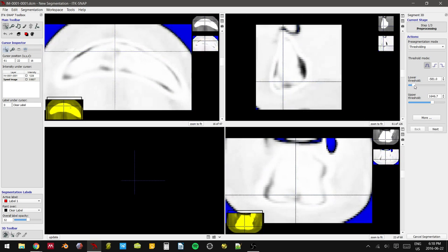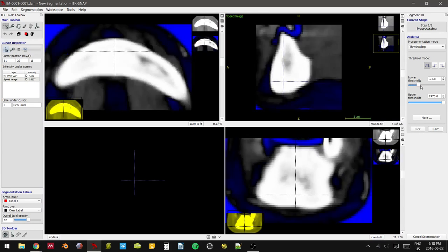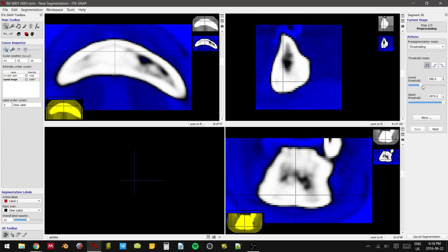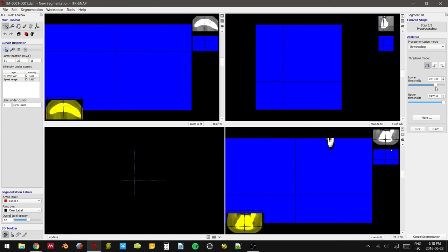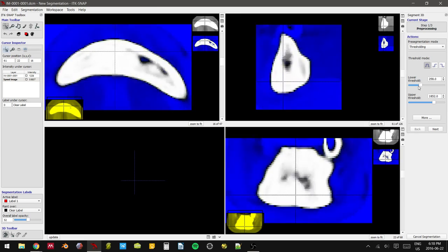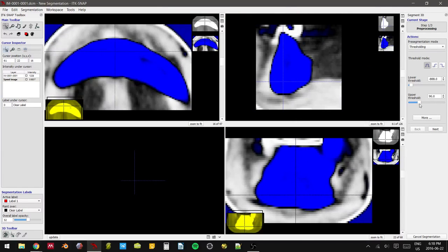And when we change these values, you can see how your region of interest is actually isolated, and we can flip it. So here we were only going to get the bone because we know that this is mandible. However, if we flip it, let's see, like this, we can get everything else that's not bone. So in this case, I think this is dermis, layer of fat here, and then some voids, just like that.